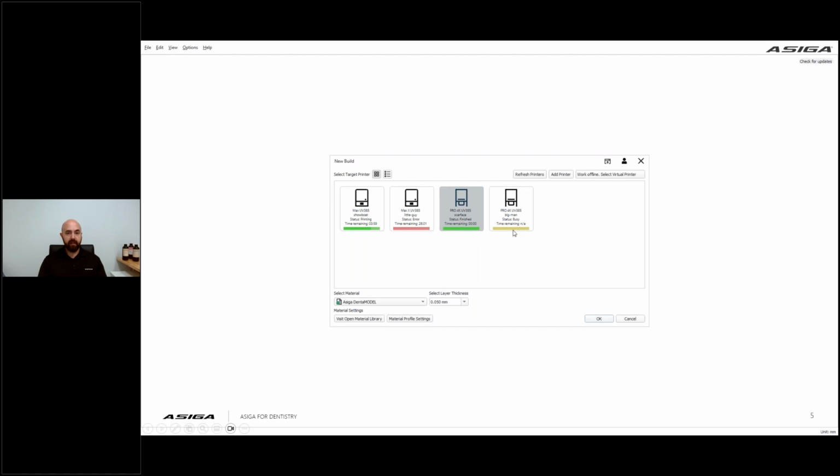And if it is in a busy status, whether it's printing itself or if it's, oh, sorry, I got that wrong. If it's printing, you'll see that it's green, or if it's finished, it'll be in green. If it is busy, as in a status, let's say you're doing a different function on the touchscreen of the printer, it will notify you that it's in a busy status and you may need to attend to it. So we'll take a look at that feature.